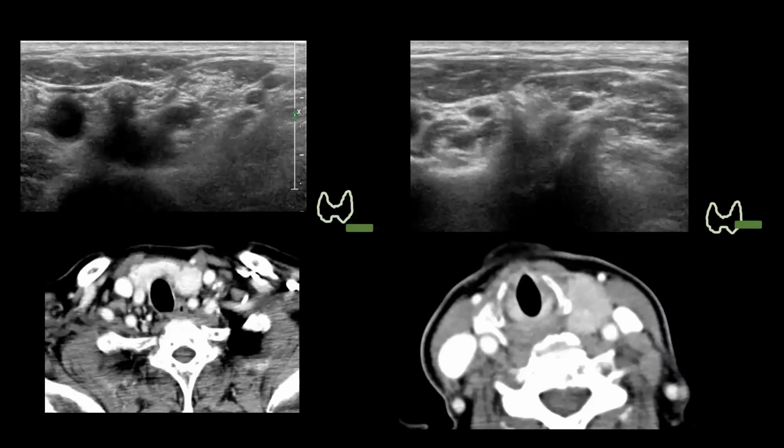Before you conclude this lesion is the anterior tubercle of the transverse process, you should consider the crown-shaped anterior and posterior tubercles connected to the C-spine body and the brachial plexus seen between those. On US, this lesion showed no connection with the C-spine and was confirmed as the calcified lymph node in the lower lateral neck. The transverse process was seen at the upper level of the lesion.